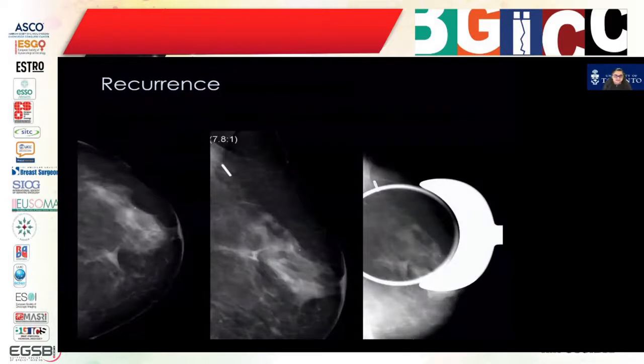Recurrence is one of the most dreaded things for any patient, any woman who undergoes treatment. Every time she comes for a mammogram, it's a huge deal because they always feel that we are going to find something. Here is an example of a woman who's had prior surgery in the central, a little bit medial left breast, and you can see that there is a newly developing spiculated mass, very subtle, but nevertheless, it was a new finding. Not so clearly identified with spot compression use, but nevertheless, it was real.